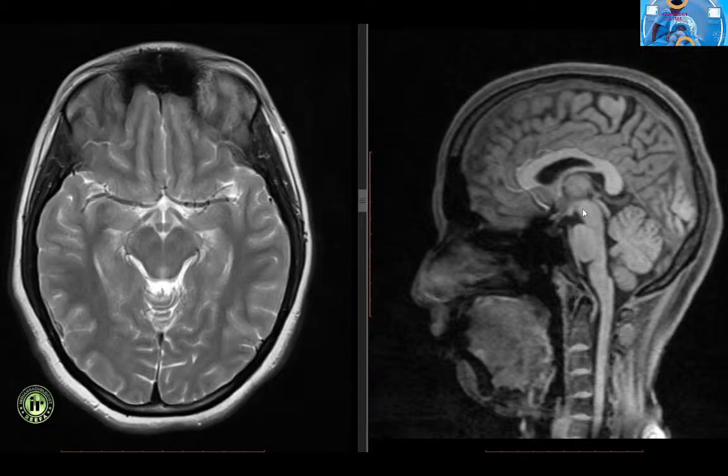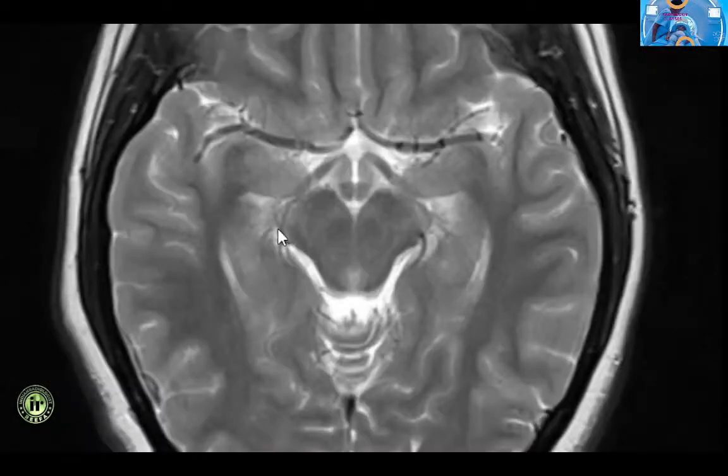The midbrain consists of paired cerebral peduncles and a dorsal tectum. Each cerebral peduncle consists of the crus cerebri and the tegmentum, which are separated by a pigmented grey matter tract known as the substantia nigra. The crus cerebri contains the corticospinal fibers.